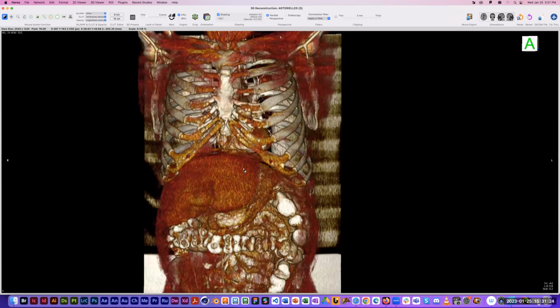All right. So that's the window level tool. There's a set of pop-up menus here. There's something called WLWW, something called CLUT, opacity. Don't worry about opacity, but these first two.